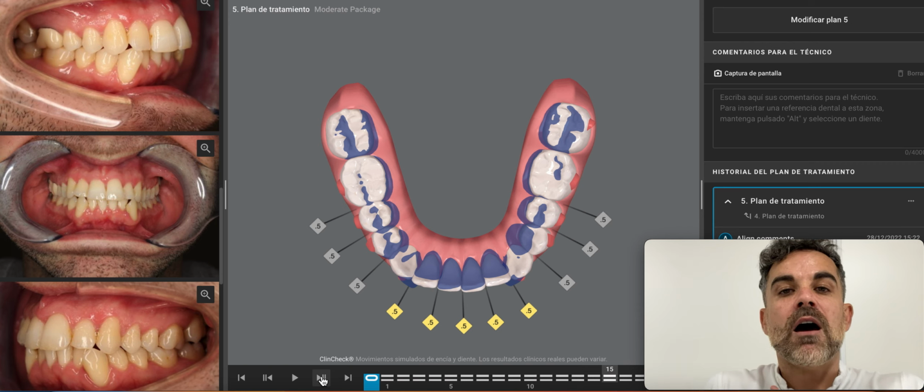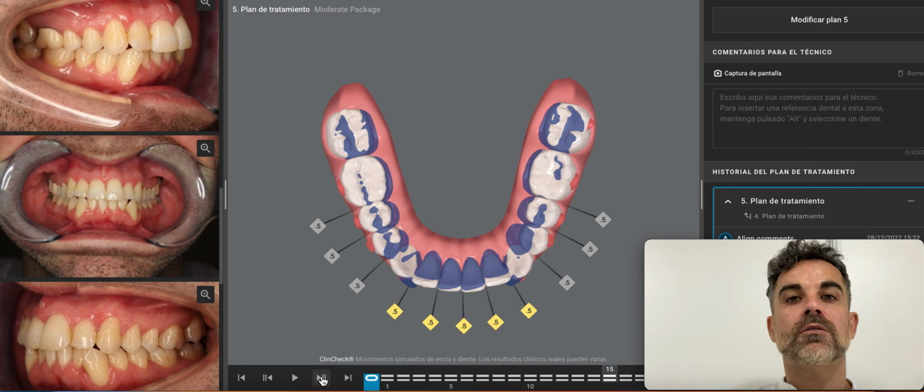This is a round tripping movement, but we need good contact points before we do the IPR in between them. When we have the stripping done, we can retrude them. This is a non-desired movement, but this is the same approach we would have with fixed appliances.